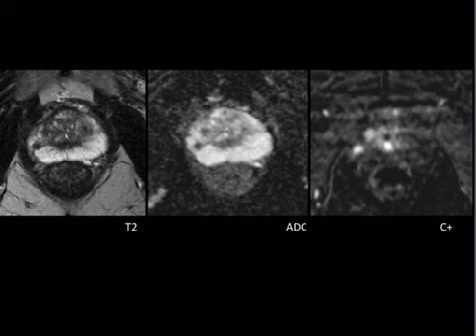And if the patient has had a biopsy recently, which a lot of them have, you need a T1 to look for hemorrhage. And that's it. Other things, it's typically done with a 3T magnet. It does a lot better than that. Some places will use an endorectal coil, which is just as horrible as it sounds. It's pretty much everything you would need to know about protocoling it.